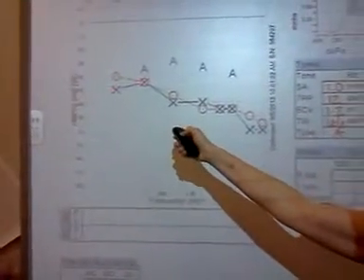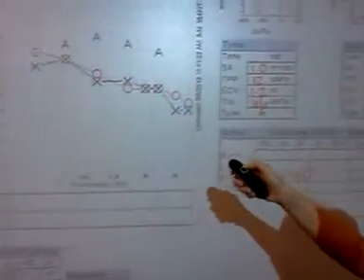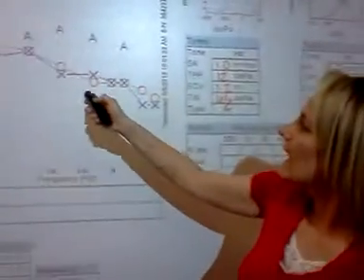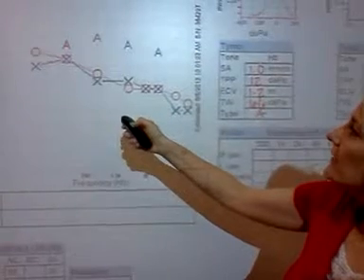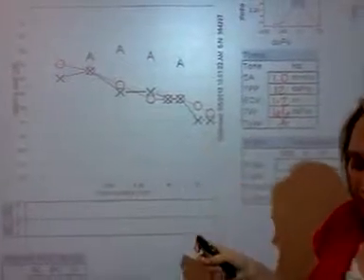Then the left ear, according to our key, shows us a blue X. Okay? And the blue X is the softest sounds that a person can hear with his or her left ear. And it's marked on the audiogram right here. When a person is tested using their hearing aids, an A symbol is used. And this tells us the softest sounds that a person can hear using their hearing aids.